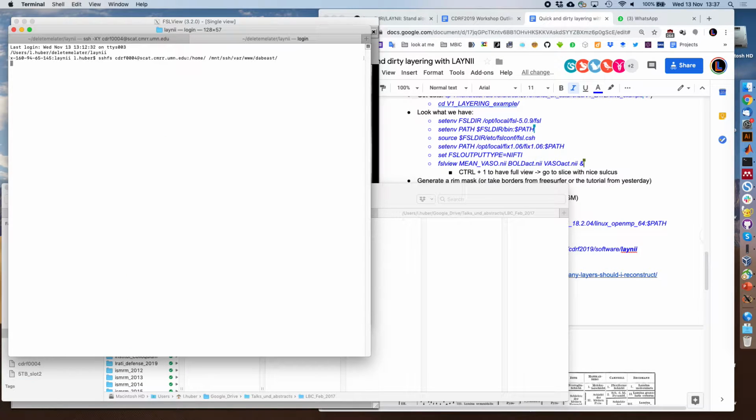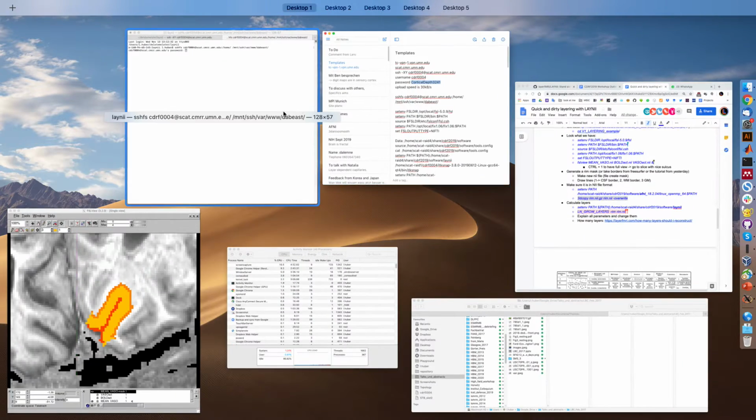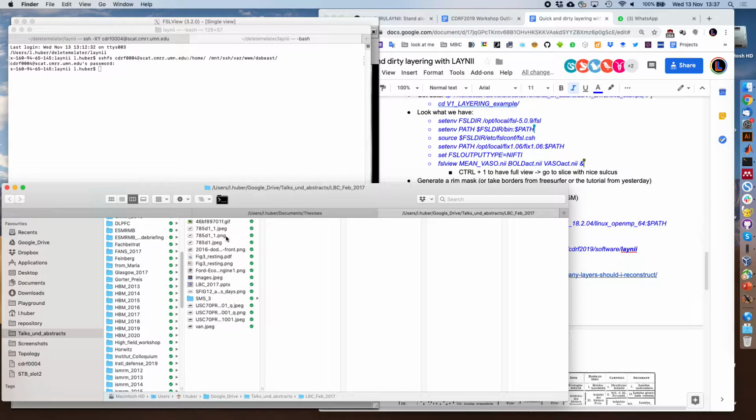Is there a reason that you use AFNI for the unzipping portion? Because I know how it works and that it doesn't screw up the headers. You can have different slopes for positive and negative values, and FSL might do the same thing. Unzipping might really depend on the unzipping algorithm, how it does it. And I want to show you why.